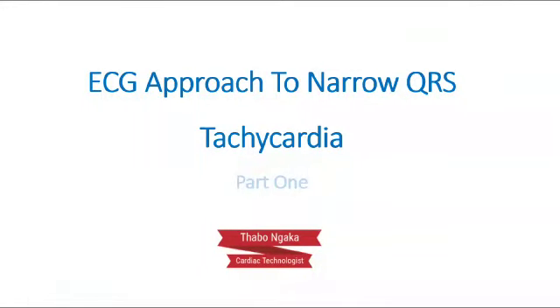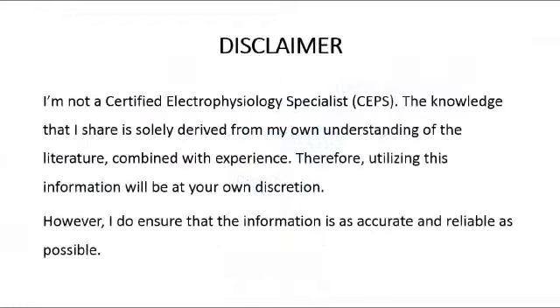Welcome everyone. We're gonna look at how one approaches narrow complex tachycardias on a 12-lead ECG. So to avoid this being a very long video, I'm just gonna divide it into different parts. So this is just part one of this video series.